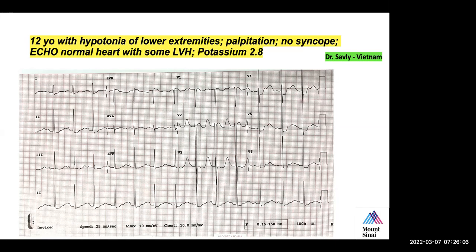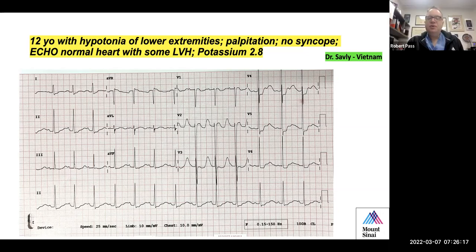And it does maybe meet the criteria for LVH based on the voltage for V5. I would probably agree with you, although Dr. Arnon might disagree, but yes, I agree. Dr. Arnon has never seen an LVH in any EKG.